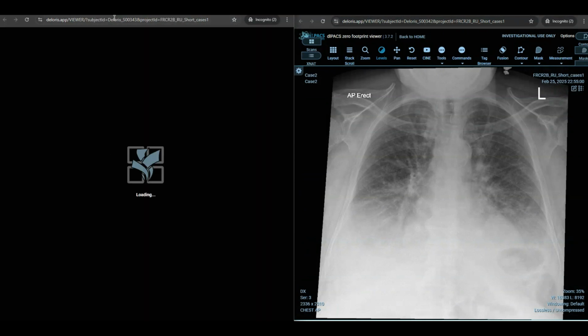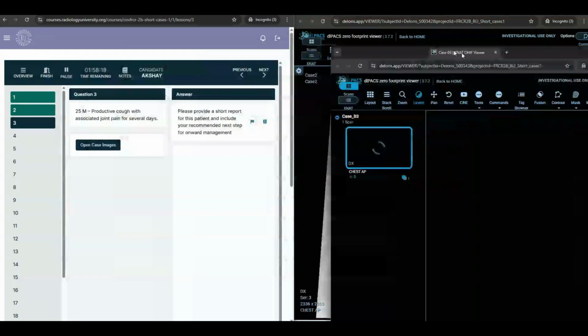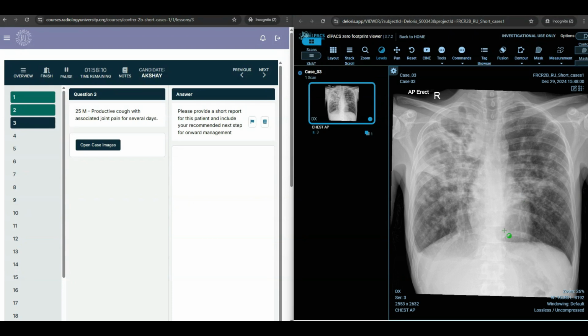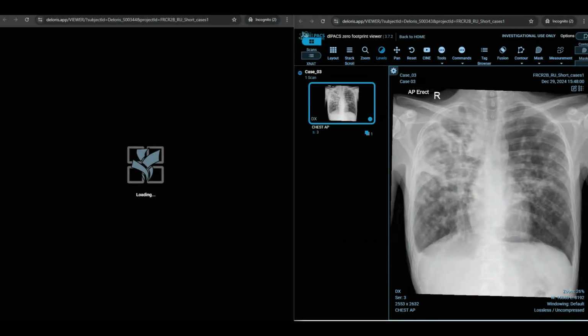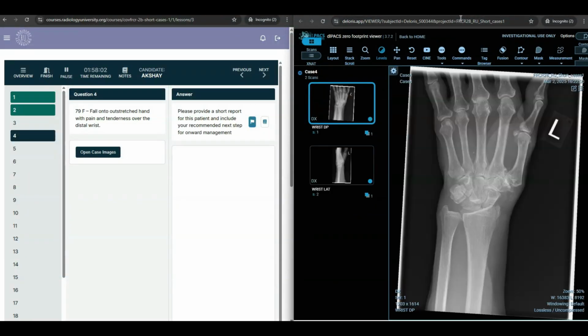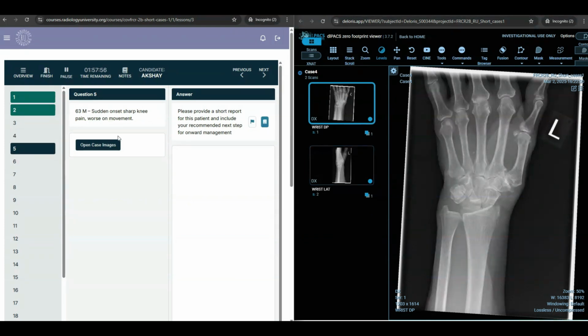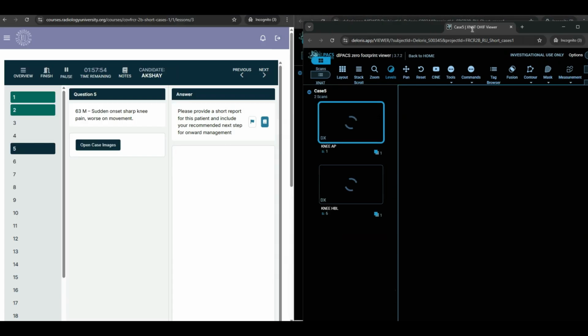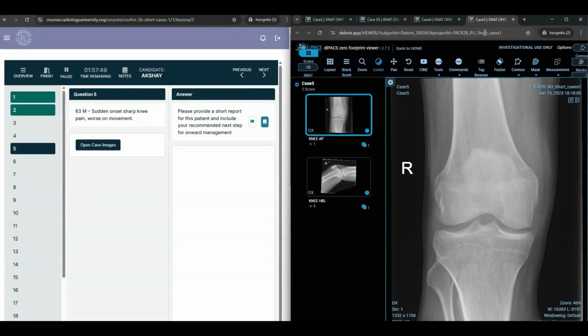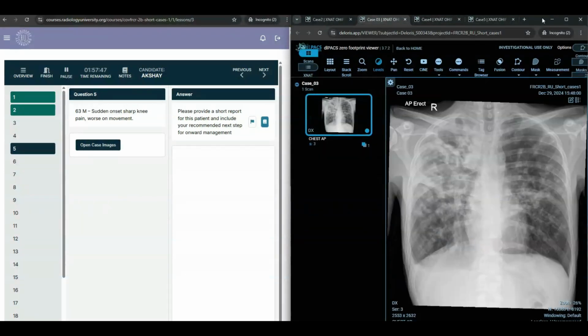Again, the same thing, you click here and you move it to the next panel, and then you wait for a second. You can also open all of them one by one, so that you won't waste time in loading. You can load 4 cases, 5 cases at a time. That's something I do sometimes, so it might make your life a bit easier.